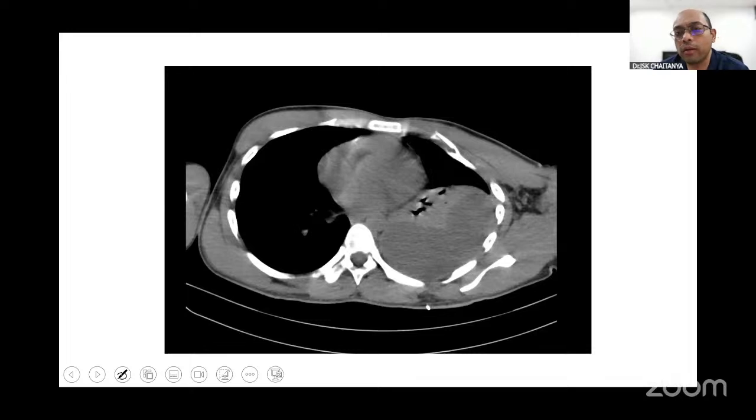The next most common thing which we see in an ICU is pleural effusions. CT can help in differentiating pleural effusions when we have loculated effusions, when we have significant posterior loculations, in those ICU patients where we get bedside X-rays and posterior structures may not be very visible to us. In such cases, a CT definitely helps. Here you can see a loculated effusion. We can see fluid not following the gravitational forces. We see fluid accumulating in two different chambers, compressing the lung structures. So when we see a loculated effusion, we need to think of infection.